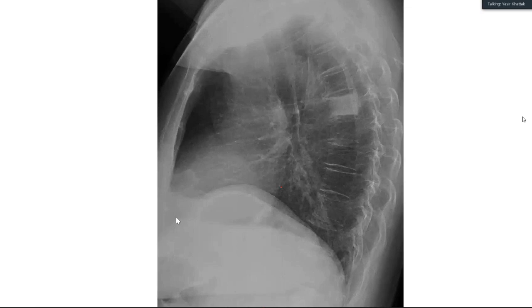So the first diagnosis, if you have more than one lesion, a hemangioma is less likely. Usually, you always consider metastasis in a 70-year-old patient when you see sclerosis. Even if you think this is a hemangioma, you must mention that a sclerotic lesion or a sclerotic vertebra points towards metastasis. In a female patient, this will most likely be a case of breast carcinoma, and then you look at the breast shadows. If this was a male patient, what would be your first differential?